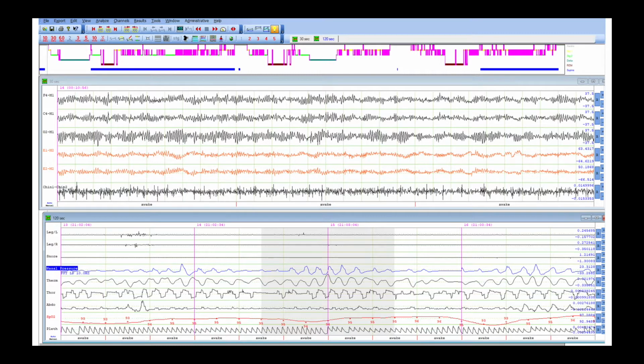It's easier when you remember that in general, these interfaces are often divided up into three panels, and each panel has a different time scale. At the top is the sleep architecture for the entire study. So from this side to this side, this whole thing is the entire study. That's the whole length of the study from beginning to end of the night. And this is called the hypnogram, and it's sort of a graphical, pictorial, schematic representation of sleep architecture.